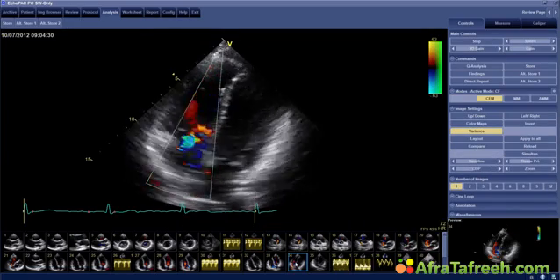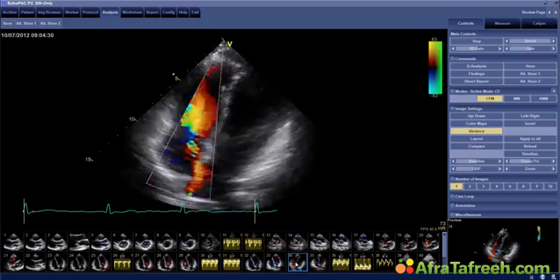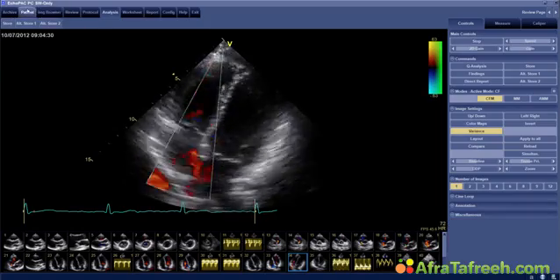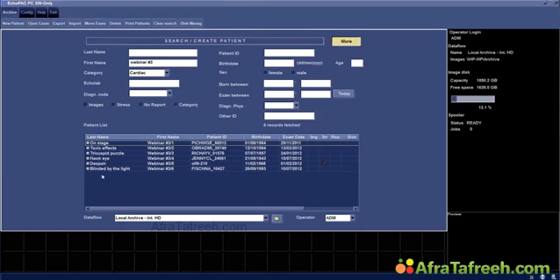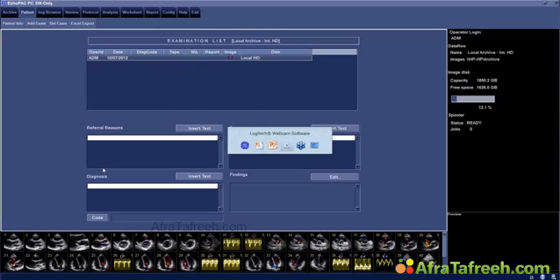What should we do with this patient? Well, since the right ventricle is dilated in this patient, the patient needs an occlusion of the atrial septal defect. And I will just give you the information that this patient actually did have a TEE study where the defect was measured at 1.1 centimeters, and she will receive an ASD occluder shortly. Okay, so Anna also noticed that the right ventricle is truly dilated. She made the right diagnosis as well.